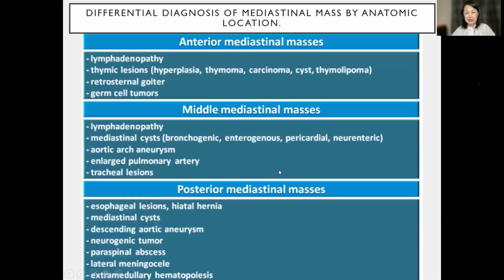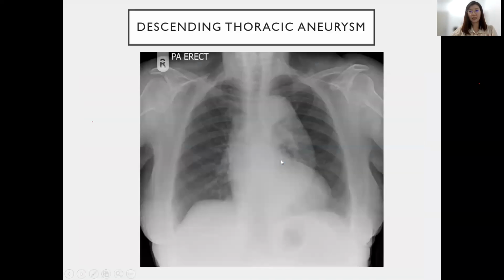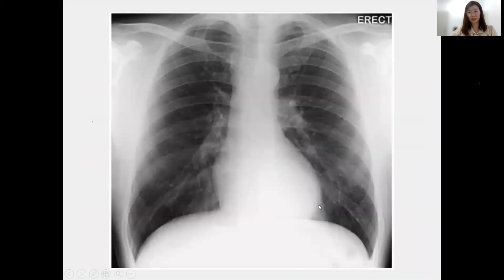Okay. Let me go back to some other X-ray. Look at this X-ray. This is a heart shadow, but it's a faint opacity. But on this X-ray it is very dense compared to the rest. So this one just wants to raise the point that you should always look at the retrocardiac area as a review area. This area is easily missed. First of all, just now, the lower lobe collapse, the triangular opacity. Next will be this kind of retrocardiac opacity.